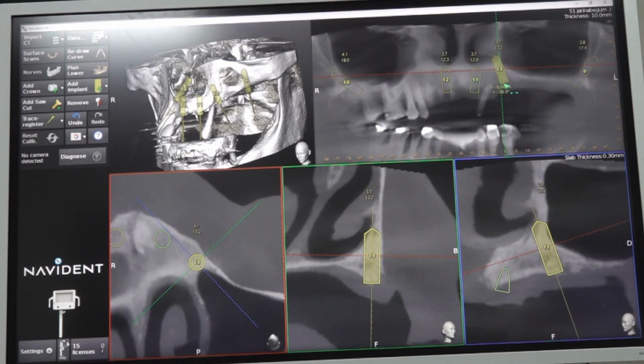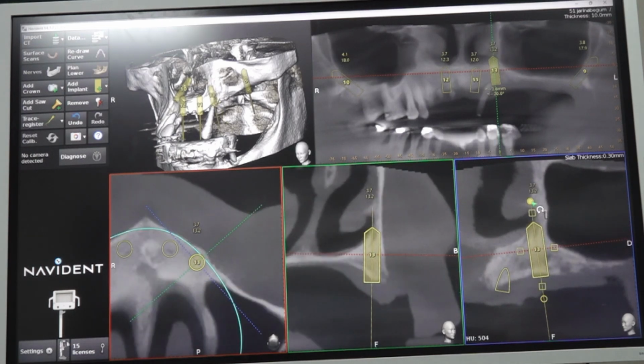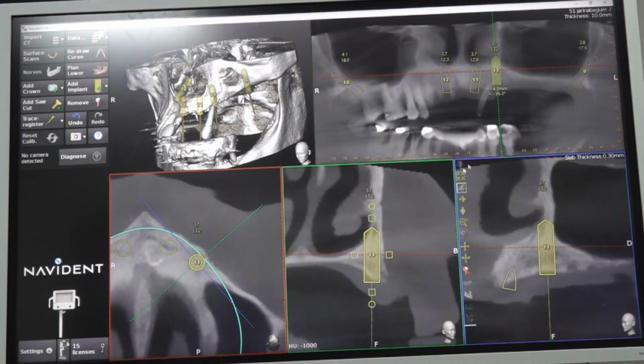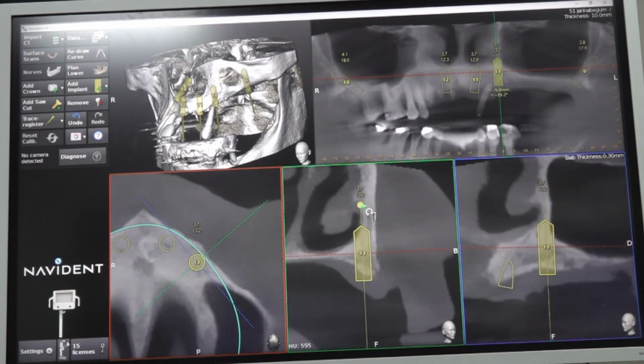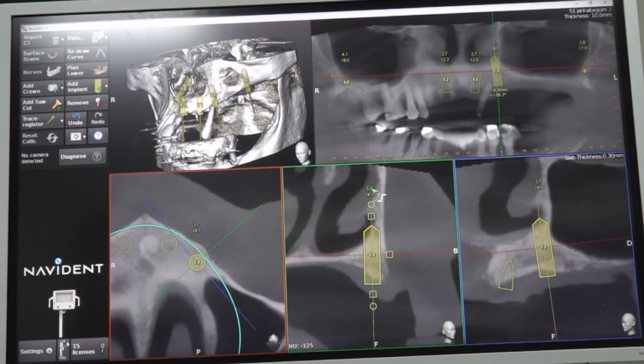But it will create problems in framework fitting and all. Since it is only 6 implants, that is not a big issue. Are we getting any great advantage in slightly distal fitting? Not that much. Since we are using a titanium bar, it will take care of everything. It will take care of the rigidity. So we will start the drilling from 24, and it will be almost like a straight implant. Mild mesial tilting, that's it.